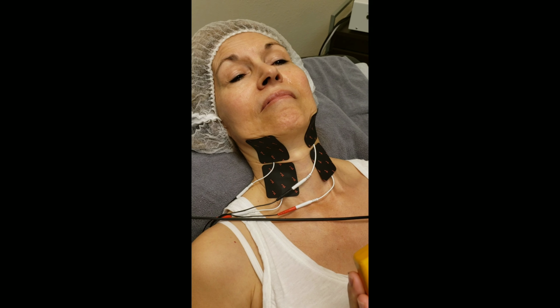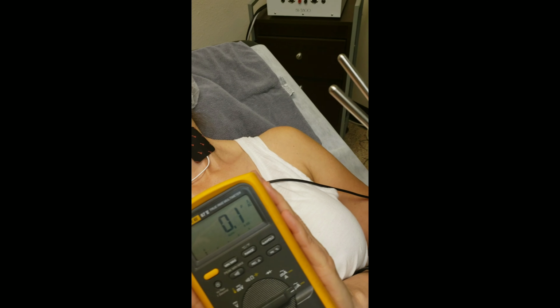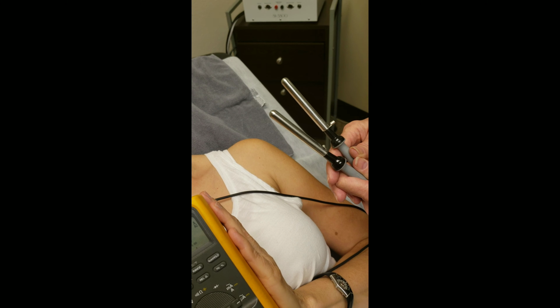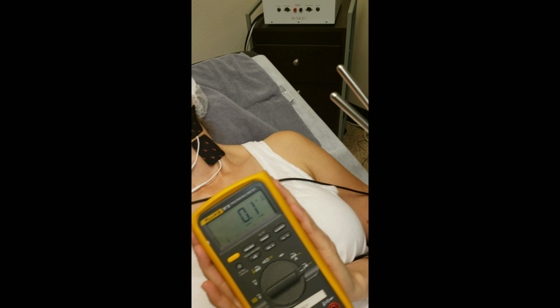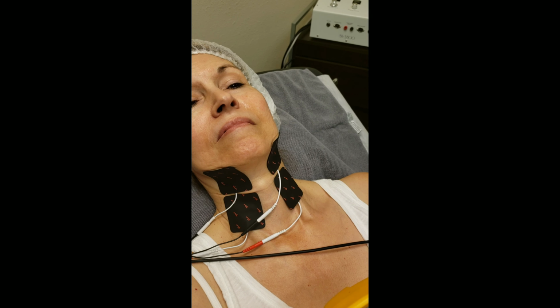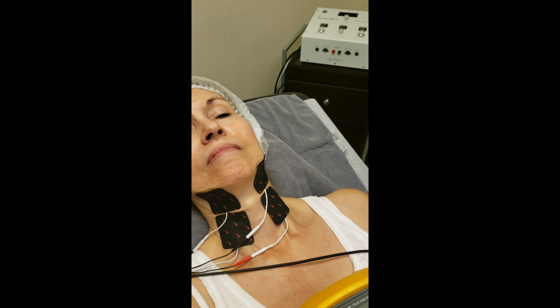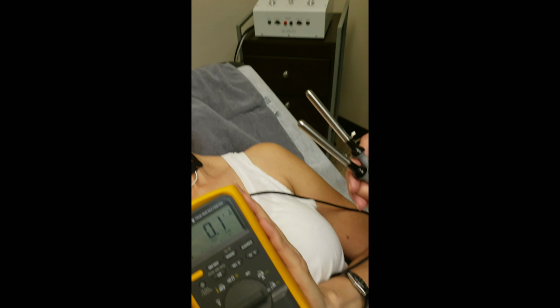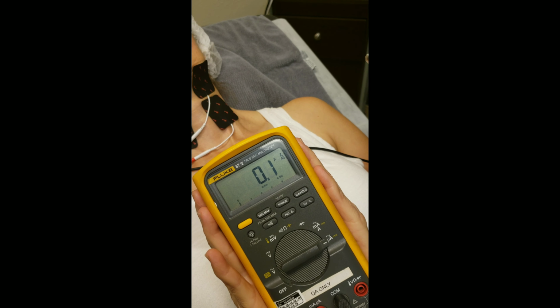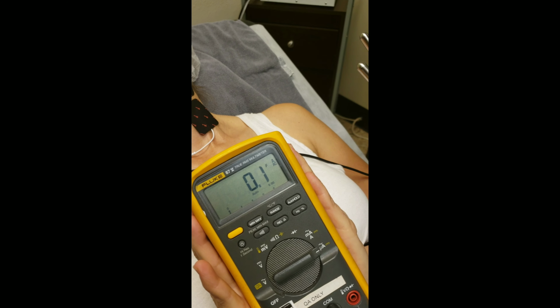Although we do have the pads connected on two of the ports, the meter is connected to the probes because we want to see what actual current is being delivered to the probes while we have the pads connected to the same channel that the probes are connected to on the first two ports. So Patricia, go ahead and right now we got it. It's because we don't have a load, so it's really not showing much current at all.